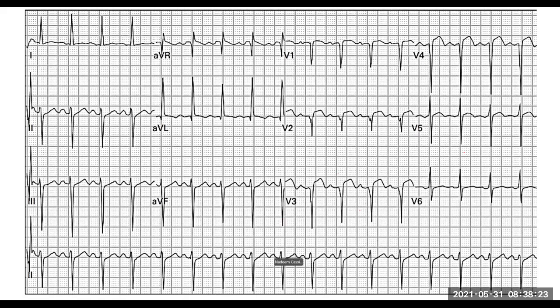ST depressions. So what does that mean? That we don't have an infarct? It's making it less likely. Agreed. Doesn't mean we don't have it, because we've got other signs of it. All right. So what could our differentials be now?